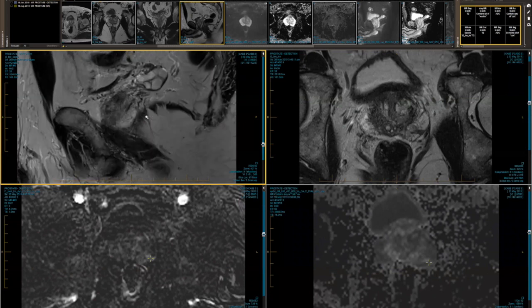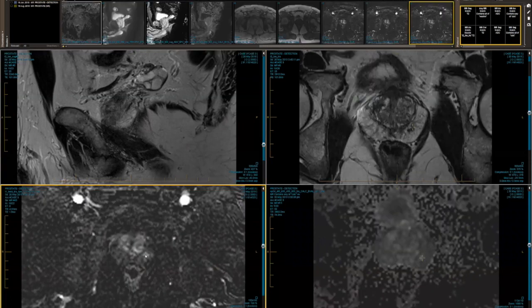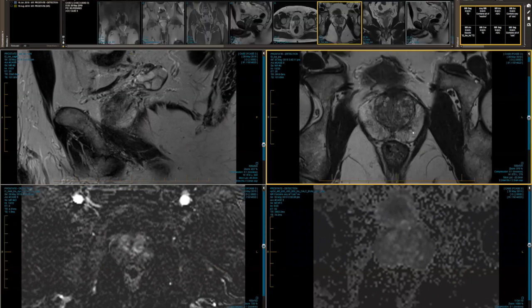The one on your picture, Andrew, looks like it's more in the mid prostate rather than the base. So I'm not sure. Yeah. For me though, the signal's different. So that signal that you've got there, the wedge-shaped bit, I can't see the scans obviously, but it just looks like there's more signal towards the medial end of it. Yeah. So I totally agree with you.